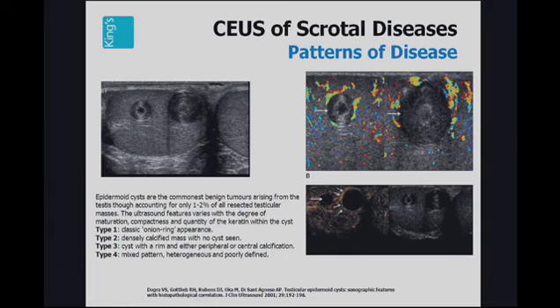In this case, there is increased enhancement around the periphery of the lesion, not because of inflammatory change, but of compression of the surrounding testicular parenchyma.